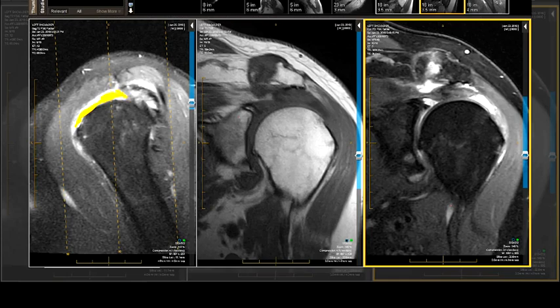It's got some of the anterior fibers of the infraspinatus. The infraspinatus interstitially looks awful. So how would I describe that? Interstitial tendinopathy and tendon fiber failure of the infraspinatus with loss of some of the anterior fibers and a complete, lengthwise, anterior to posterior, full depth, full thickness supraspinatus rotator cuff tear with a medial lateral retraction dimension of X, measure that, and severe tendinopathy and tendinosis of the retracted fibers, which is your way of saying, hey, you want to sew that back, that's some bad tissue.